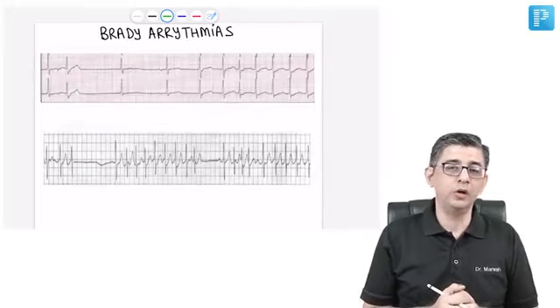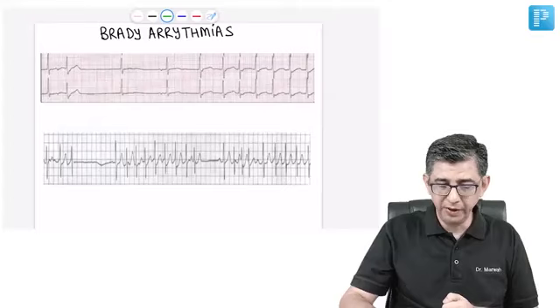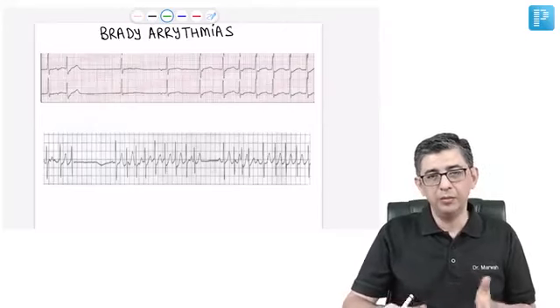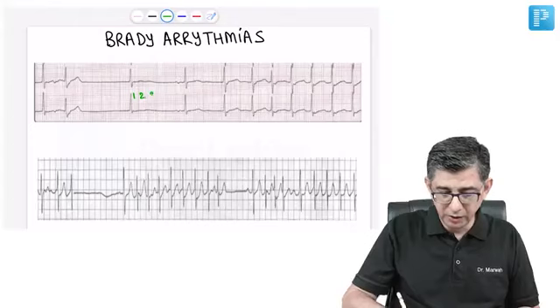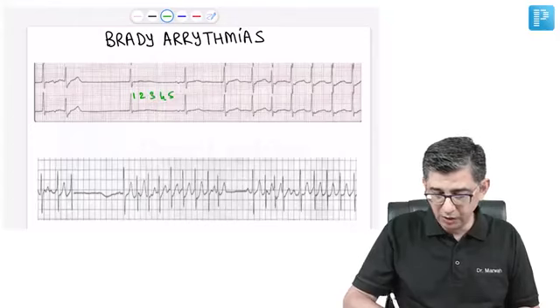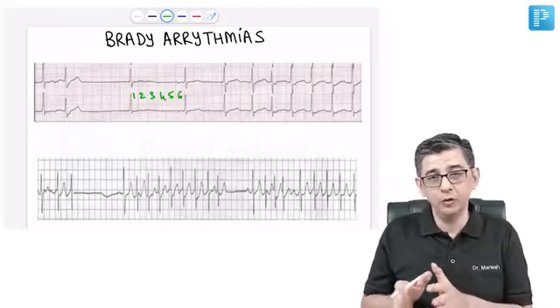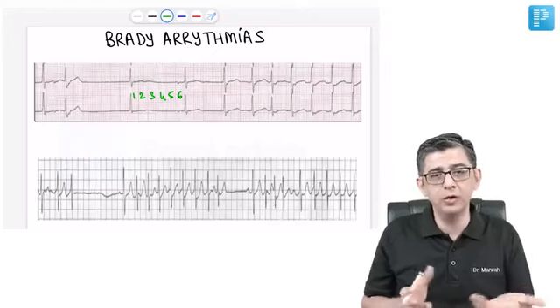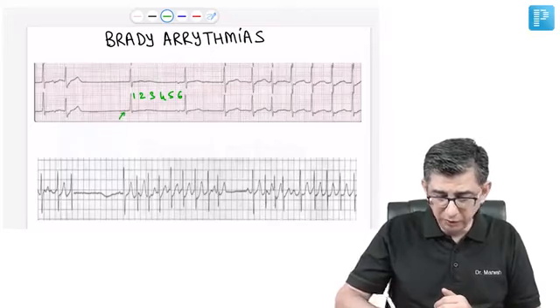Now we come to another component of the ECG, that is to talk about bradyarrhythmias. I personally find them very fascinating and also relatively easier to comprehend. Because when it comes to bradyarrhythmia, the number of squares between the R and the R interval are so many that it gives you a breather actually. You get the opportunity to evaluate simultaneously. While you are counting this, you will also be looking at, is the P wave present? And I could not decipher the P wave.